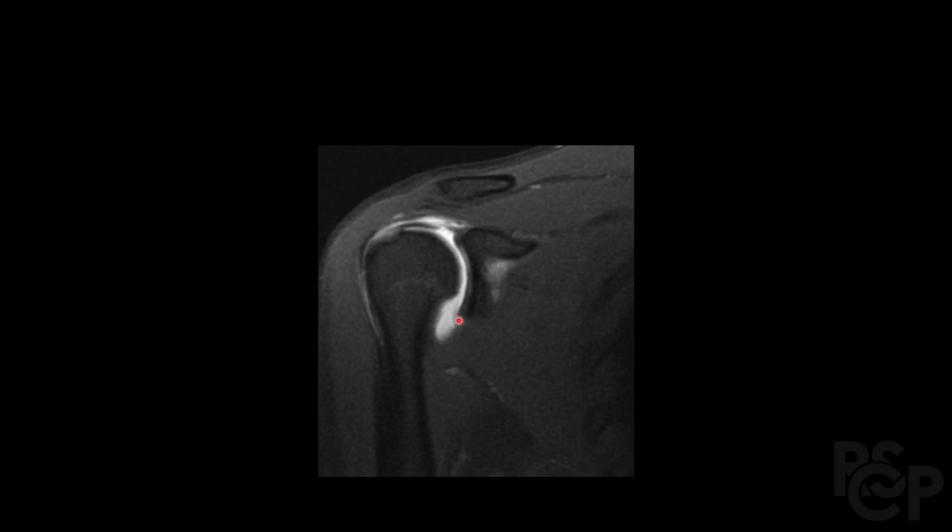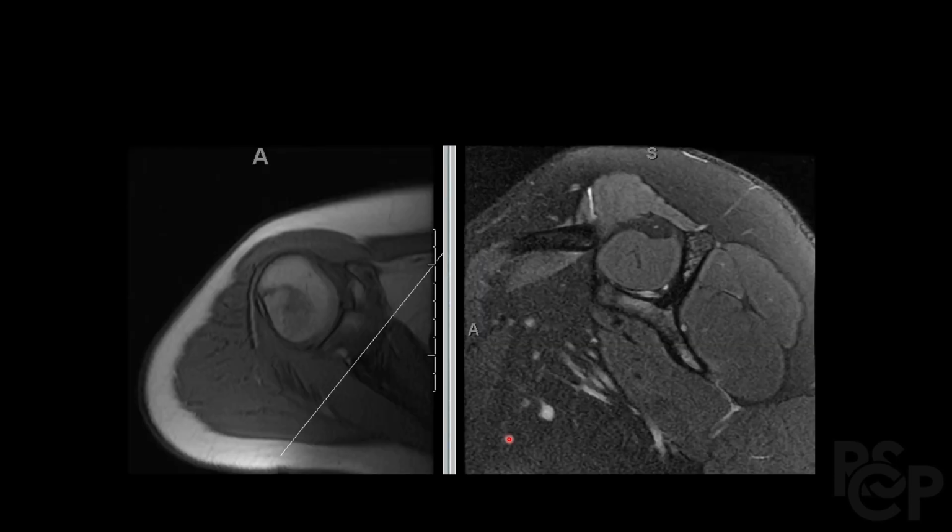One of the other things to look for is the long head of the bicep tendon, which is right over here, kind of goes here. And so in this coronal oblique orientation, we worked our way from more posterior to anterior, and some of the structures we noted were the rotator cuff muscles, the AC joint, the long head of the bicep tendon, and the superior and inferior labrum.